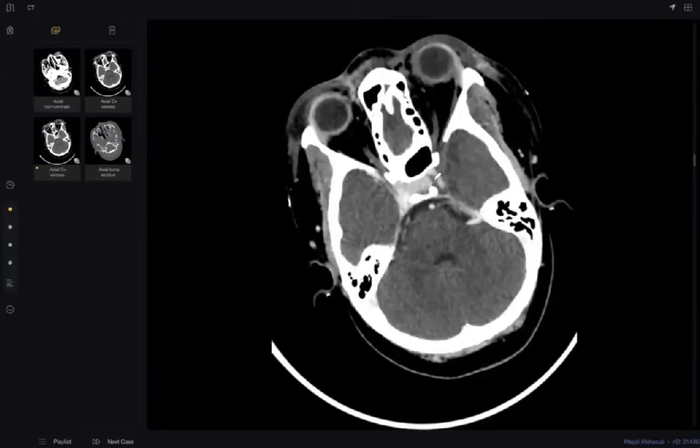We see only this enhancement, which represents the carotid segment, but around it is black. In comparison, here you can't differentiate the internal carotid artery from the sinus, because the cavernous sinus is enhanced. So this is another evidence of invasive fungal sinusitis with possibility of intracranial extension.